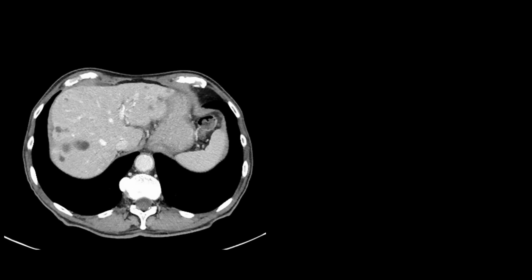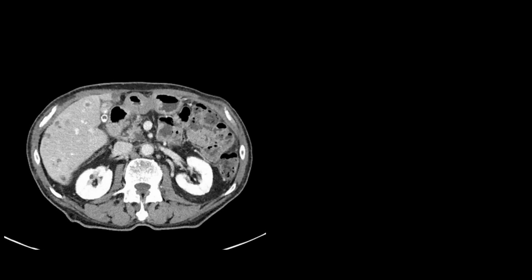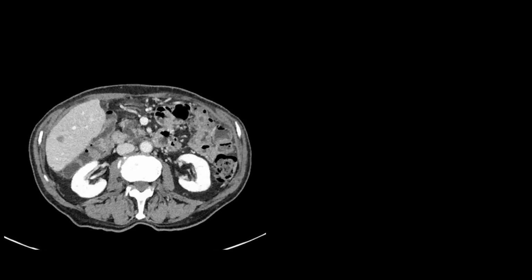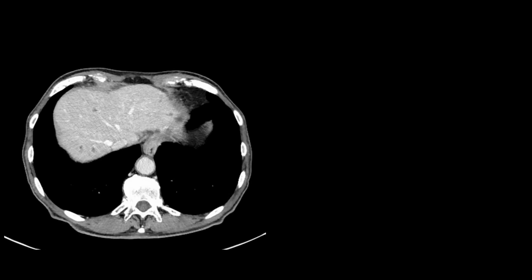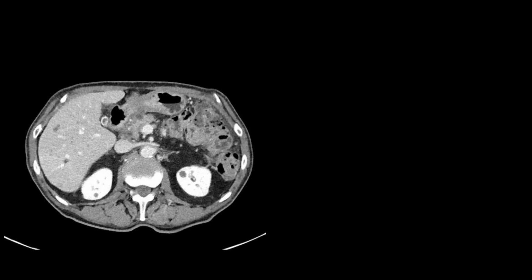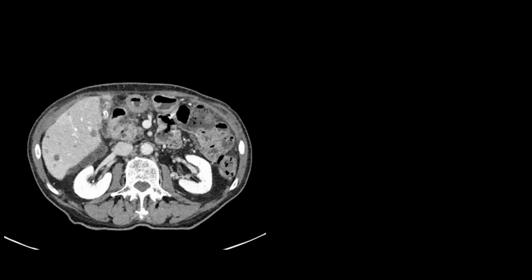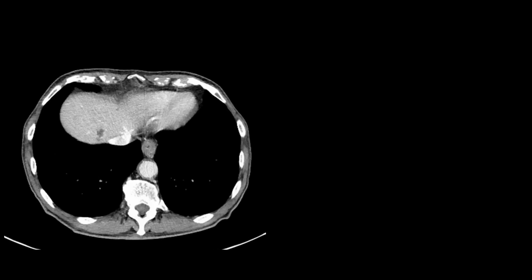Here we have a case of a patient with known neuroendocrine tumor that was widely metastatic to the liver. This was treated with bland embolization, so hepatic arterial embolization, a common therapy for neuroendocrine tumor. I would say that this post-treatment CT scan in the portal venous phase, if you only had the portal venous phase, you would say that there's little to no residual enhancement of these nodules or masses. And this was a good treatment response with little to no evidence of viable residual tumor based on imaging alone.